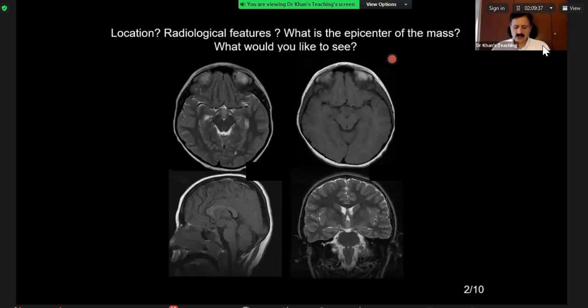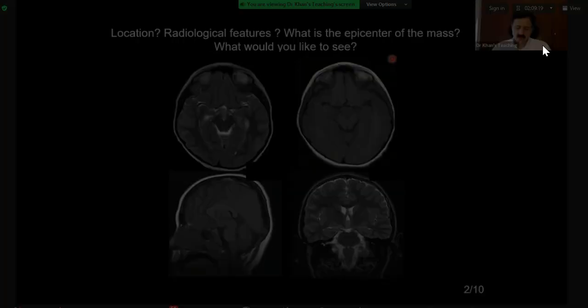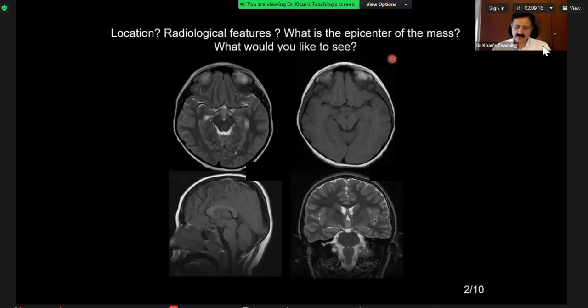So what is the location? I would like a post contrast T1 series. Okay, I'll give you a post contrast. What is the location? Scratching my brain. It's the beak of the hummingbird. No, it's gone. My brain has gone.